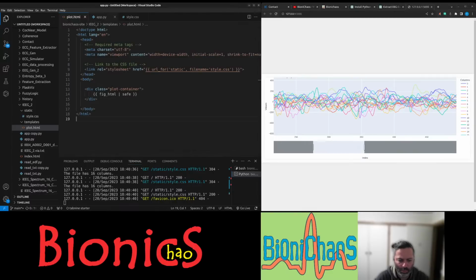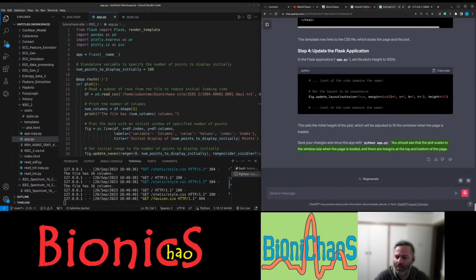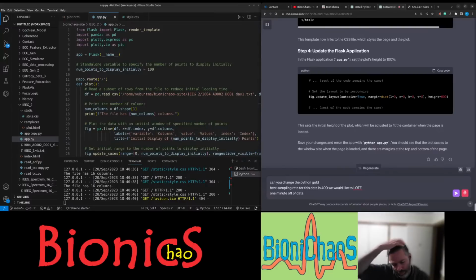Can we change the Python code? The sampling rate for this data is 400. We would like to load 1 minute worth of data and display 10 seconds to begin with. So the scroller is 10 seconds and we can scroll over 1 minute.